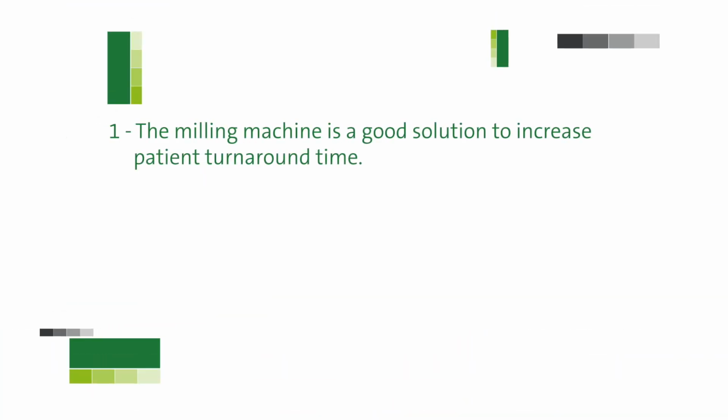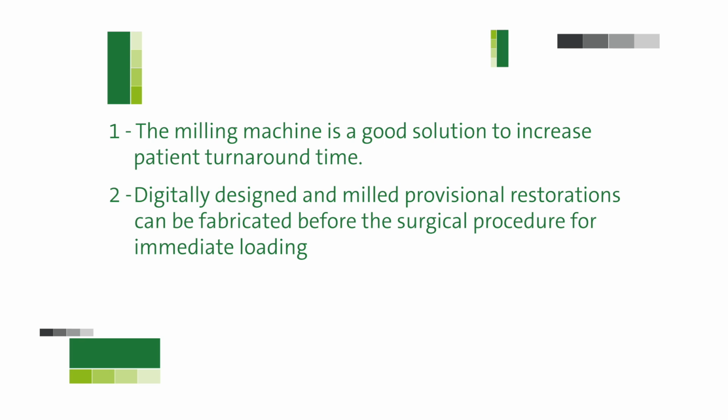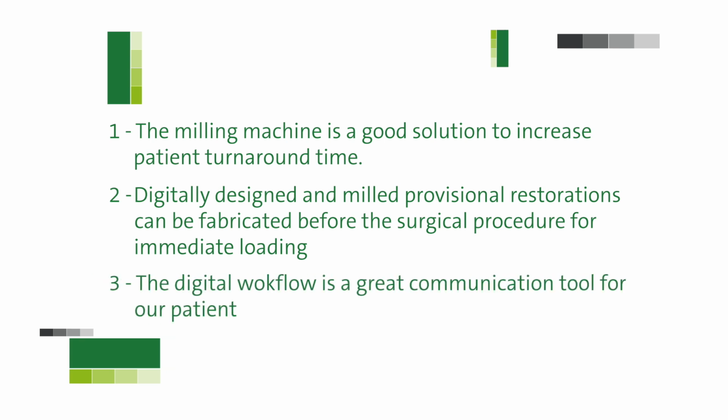So, we saw that advances in digital technologies provide clinicians with the tools for diagnosis, treatment planning, placement and restoration of implants in a truly transformative way. To make the most of our digital workflow and increase the effectiveness of our final results, the milling machine is a good solution to reduce our time, material waste and costs. Digitally designed and milled provisional restorations can be fabricated before the surgical procedure for immediate loading. The digital workflow is a great communication tool for our patient. It helps us to show them in advance the final outcomes and to present them the most effective and precise treatment plan they need.